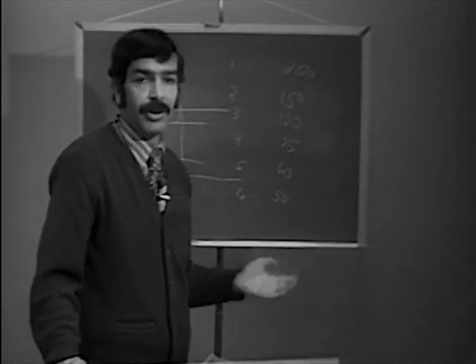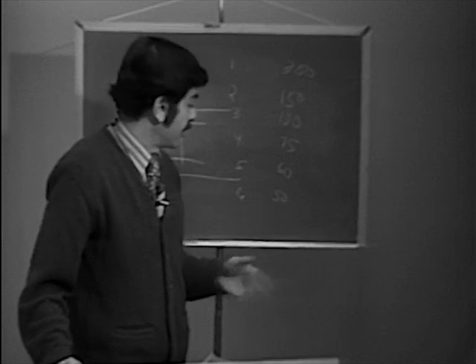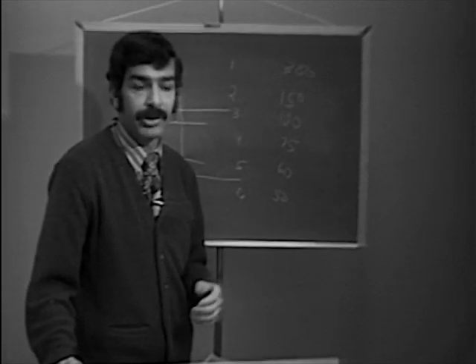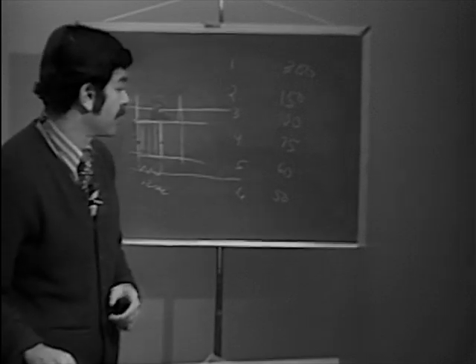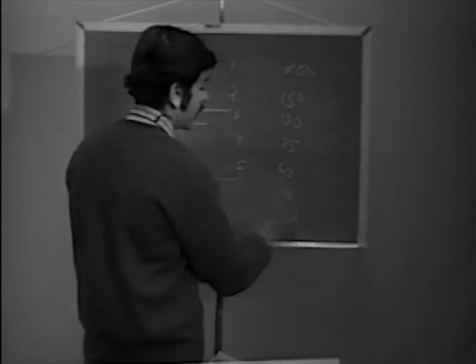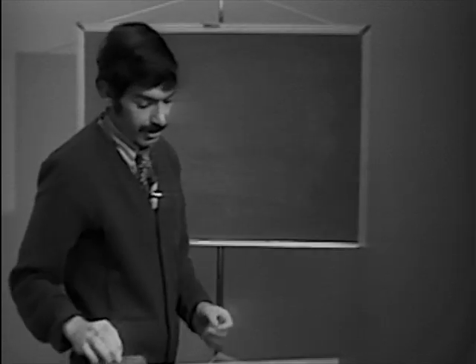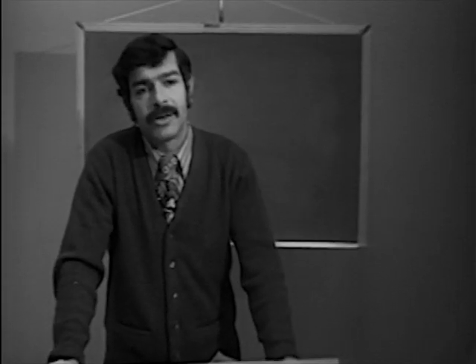In most cases, you really don't need to know whether the heart rate is 55 or 58, and you can come close enough if you just use this rough guideline, providing the rate is fairly regular. If it's irregular, you have to do some averaging if you just have a short strip. Okay, so these are 2 very simple and practical ways for determining heart rate. You can't spend a lot of time just determining heart rate because you have an awful lot of other things that you have to do in assessing an electrocardiogram. Okay, the next thing I want to talk about is intervals.